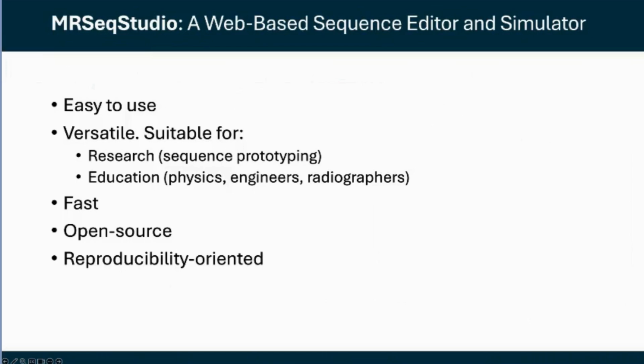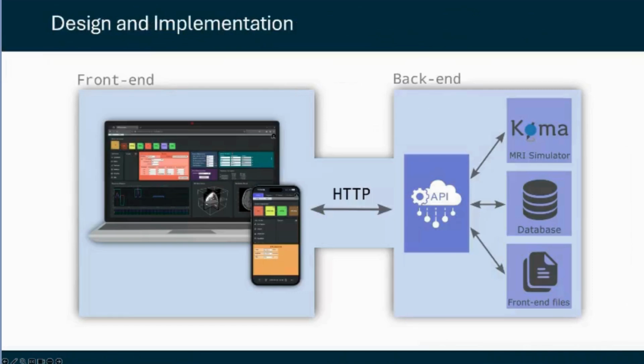With that in mind, let me give you a sense of how everything is put together, a very high-level overview. The tool is structured like any other web application. First, we have a front end, which is the user interface you actually interact with in your browser. And by the way, it's responsive, so you can even run it from your phone, just in case you ever feel like developing sequences from your mobile phone for some strange reason. But in fact, it might be useful for students or for testing simple experiments using it from your phone.